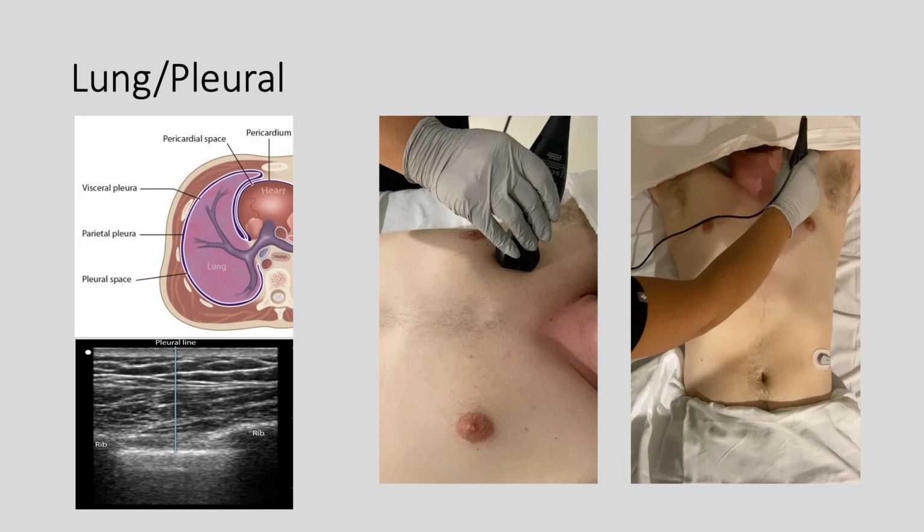Lung ultrasound is heavily dependent on the interpretation of lung imaging artifacts and sonographic signs. Normally, ultrasound signal is blocked at the pleural line by the underlying gas. Following lung injury that extends to the pleural margin, injured lung tissue develops the ability to transmit image artifacts as a result of gas and fluid interactions within the lung tissue beneath the transducer.